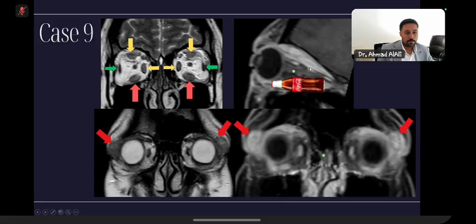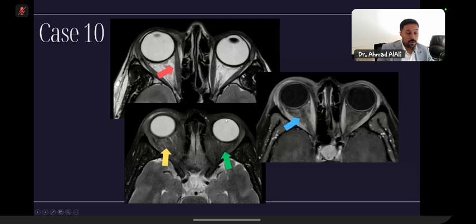This appearance of muscle enlargement comes with sparing of the tendon. Actually, they liken it to a Coca-Cola bottle. Some books and articles refer to it as the Coca-Cola sign. Just to remind you, it doesn't involve the tendons, so it spares the tendons.